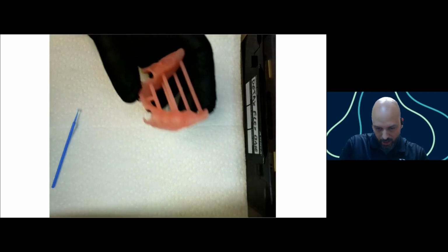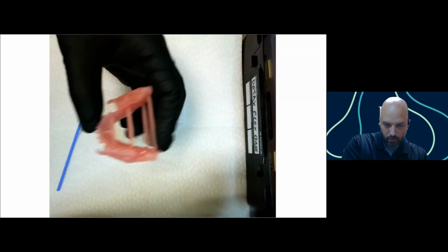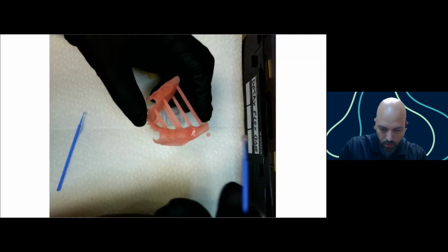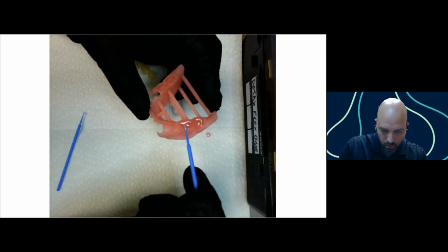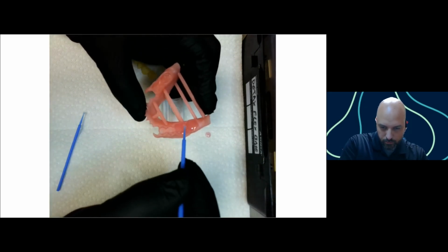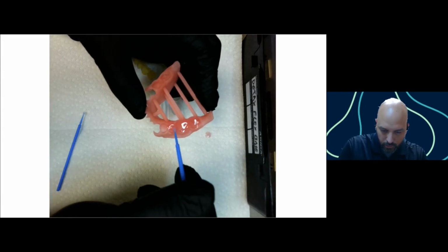So I'm going to start doing that here. And I'm just going to drop it in. Like this.